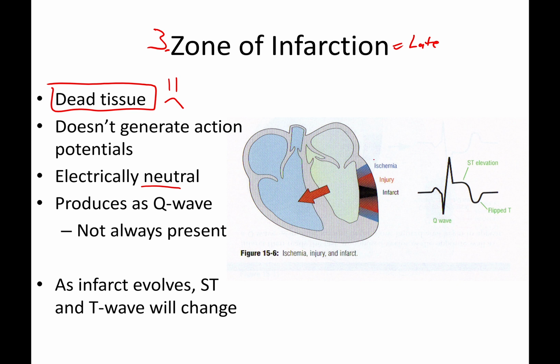And so as I divvy these parts out with your infarct, your injury, and ischemia, your ischemia will have that ST depression and then inverted T waves.